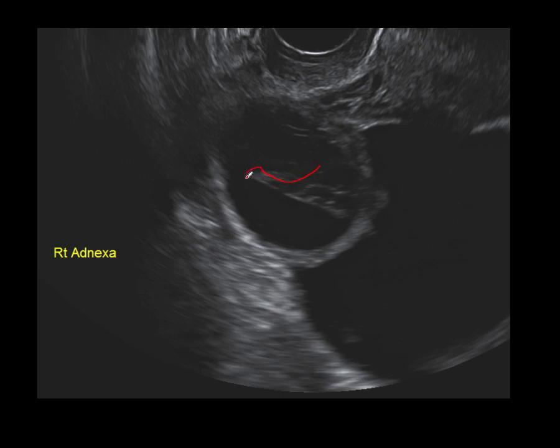So you might get a piece of clot looking like this, with a concave internal appearance, whereas malignant tumours tend to be pushing out all the time, pushing out in the middle and pushing out on the margin, like this. And because this is less than 5 centimeters, we're able to just ignore it and it will resolve spontaneously.